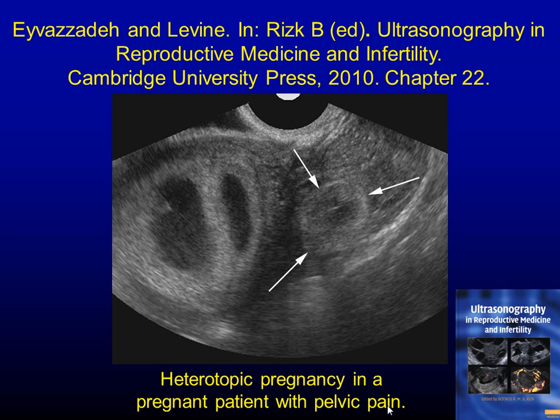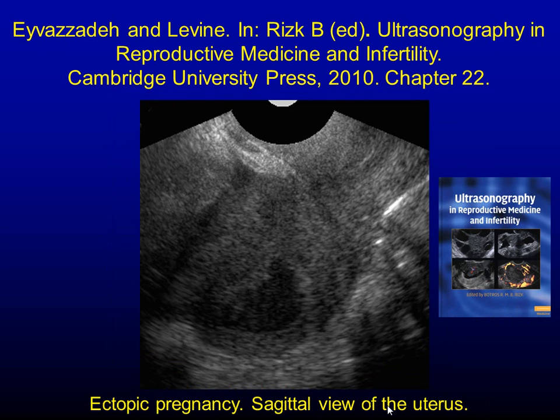Problem is that the uterus is very, very vascular, and I'm sure you scrubbed on many of the recent cases where they had interstitial, and you see how those patients are more likely to bleed. So this patient also had an ectopic. We looked at her, and she had this area. So this was not the ectopic. This was a corpus hemorrhagicum. This was just her egg, and then the ectopic was here. So an ectopic pregnancy could be concealed as well.